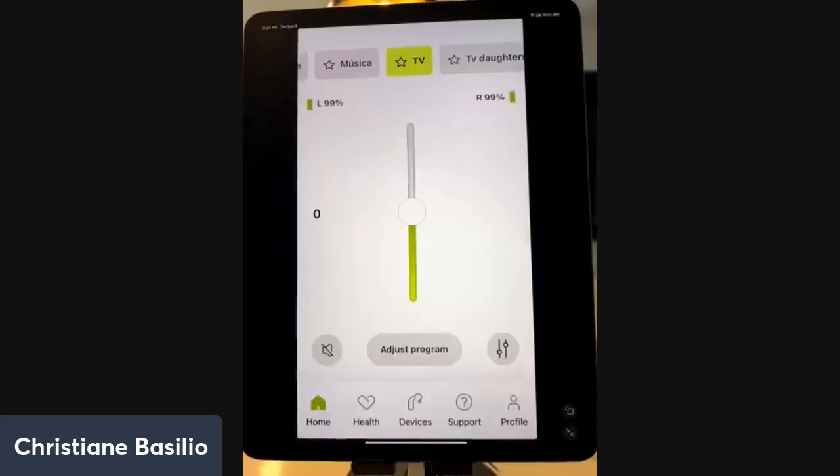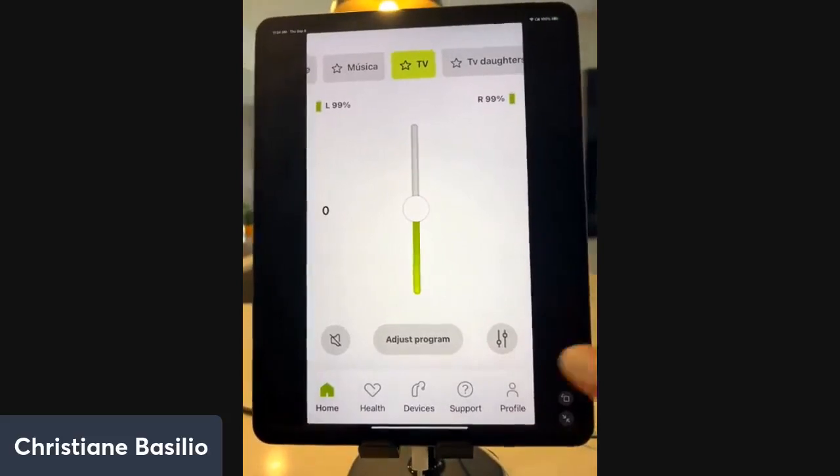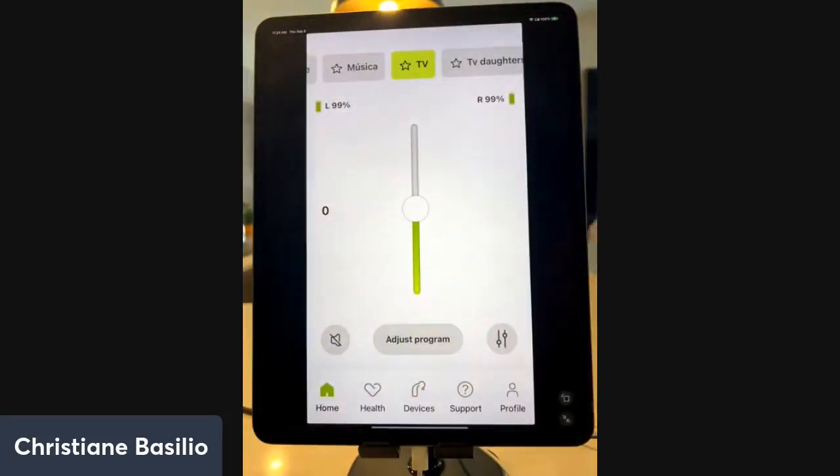Let me show you a few things now for troubleshooting, and I will switch my camera again and show you a few things I want you to check on your phone. So let's switch, and I'll try to keep the camera a little further away, like that. Okay, so a couple of troubleshooting steps on the app. Let's keep it on the app for a moment.